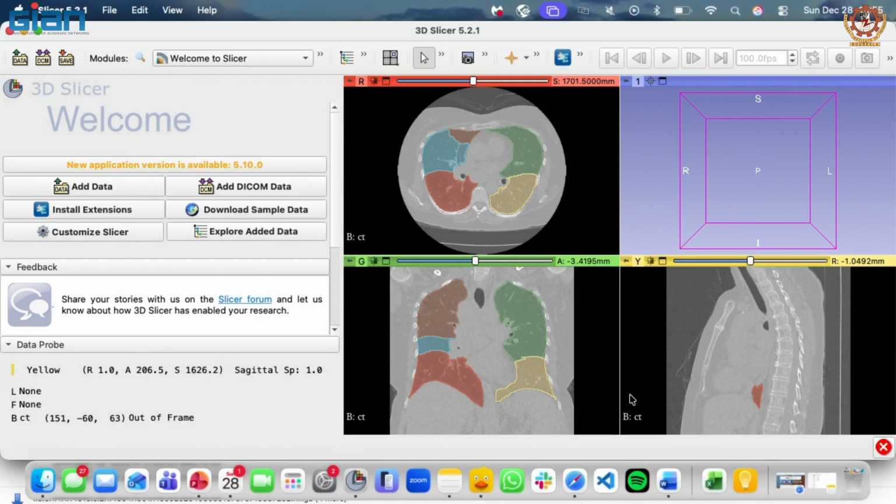A very simple, well, you guys are in undergrad, we should not give homework, but what you can try to do is try to do the same thing in ITK-SNAP at home. You remember yesterday I was talking about another visualization tool, ITK-SNAP. You can upload the CT and upload the lobe segmentation in ITK-SNAP. It's just like another visualization tool. I think most of the tasks you can do using 3D Slicer, but it's good to know other segmentation tools.